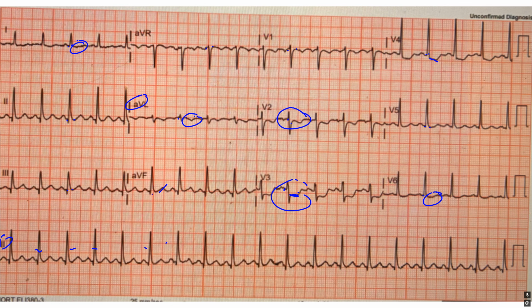Okay, now, is this an infarct? Well, according to the American Heart Association, only if we do posterior leads. Okay, because remember, this is V2 and V3. The special circumstance of V2 and V3 is your sex and your age. If you're a woman, it's 1.5. If you're a man under 40, it's more than 2.5. Over 40, it's 2. And if you have ST depression, that could be a posterior infarct, but you have to do the posterior EKG to confirm that.